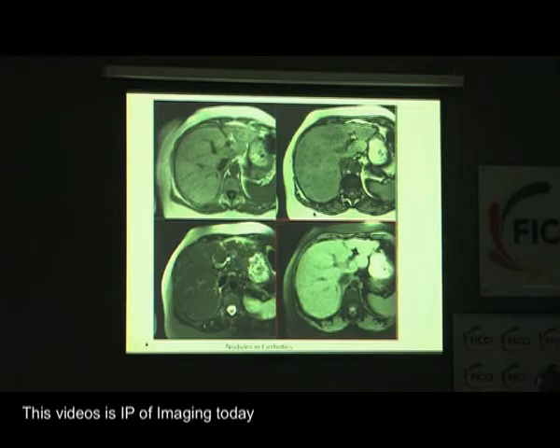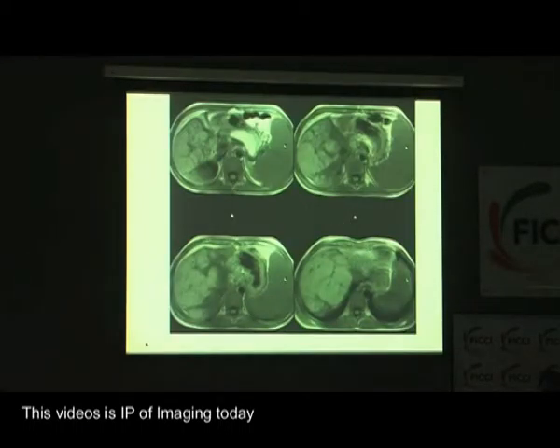Again, you don't have to go too much into contrast in all patients. I will show you some examples of that, but if you use the standard T2s and T1s with an opposed phase, you will be able to see that these nodules are nothing but normal parenchyma. Here's another patient with cirrhosis. You can have issues with diagnosis.